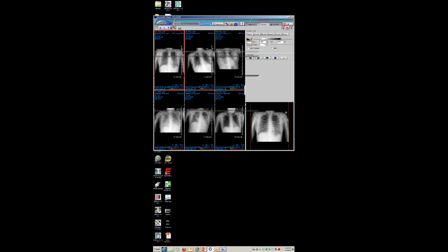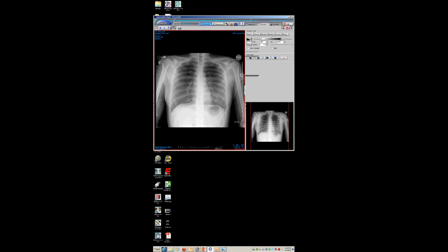So this is a case of a young woman who presented to our emergency department. This is an older case, you can see from the date, but no significant history, a student at UCSD, healthy patient, came in feeling cough, feeling ill, had a chest x-ray, which, you know, was definitely not normal. There's bronchial thickening, she's hyperinflated. She had a presumptive diagnosis of some form of viral illness.